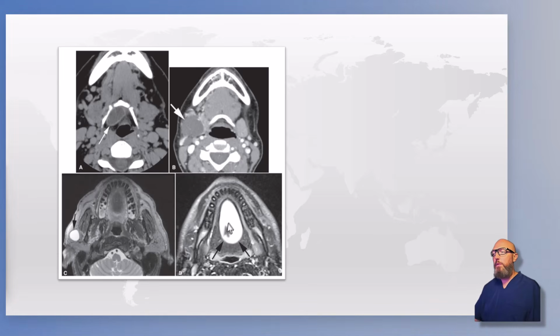How about this one? Hopefully you recognize where that is. Do you appreciate that these are teeth? This is a mandible. This was a maxilla. Hopefully you can recognize the shape of the teeth. Even if you don't know what MRIs look like, when it has the teeth in it, I would expect as a dentist, you're able to recognize what you're looking at.